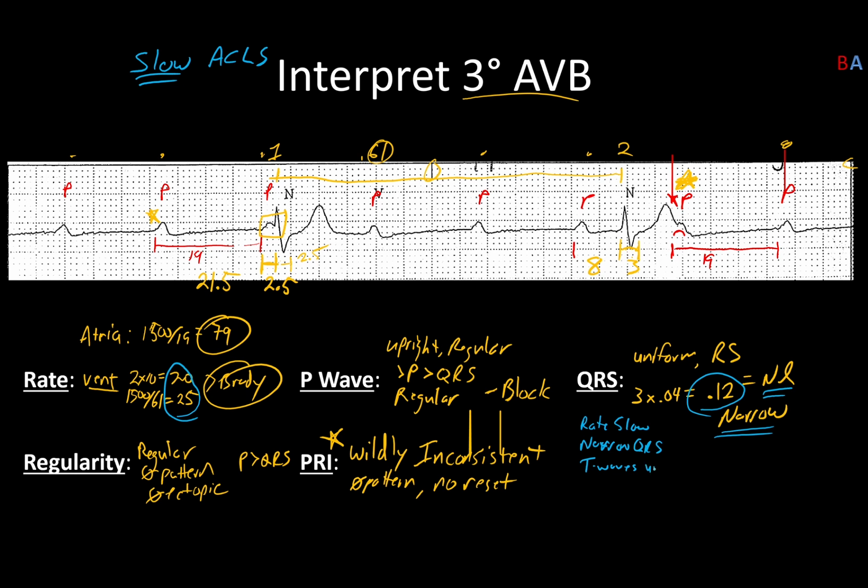I'll say upright. And yeah, we've got that QRS on top of P's. But it meets all that criteria for no retrograde conduction, especially beat 1 here, where you know that QRS is right on top of that P wave, which is pretty interesting. Ultimately, the narrow QRS clues you in that it's a junctional escape that we're dealing with. So third degree heart block, or third degree AVB.